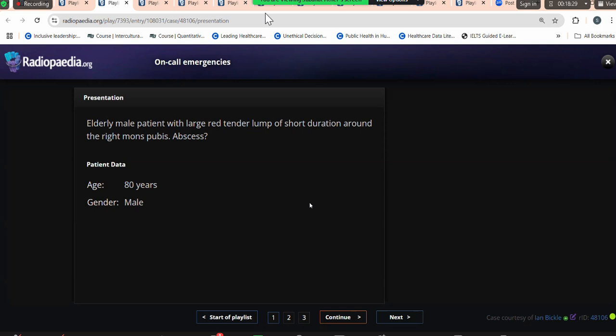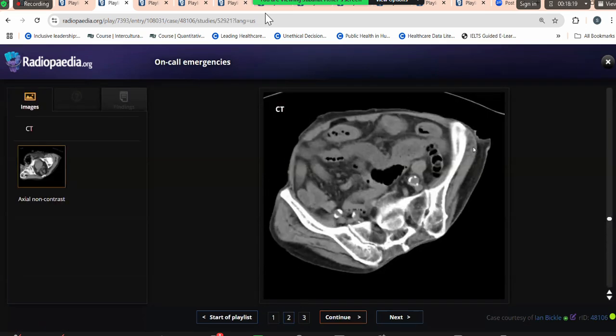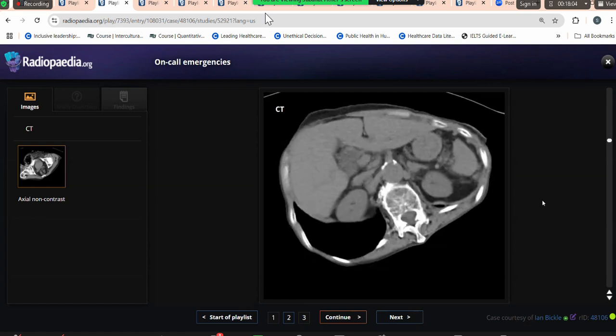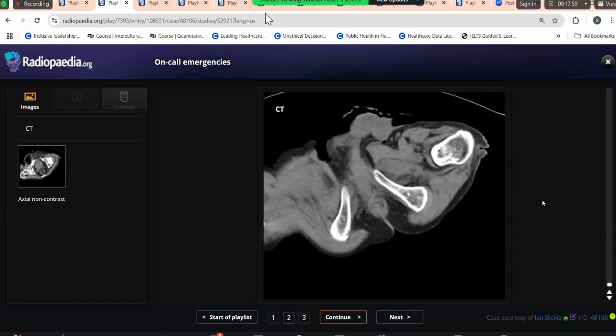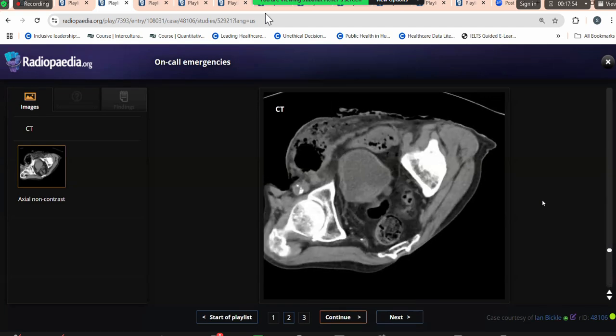And one thing which I want to feedback to all the candidates and all the participants here is that it is very important that you take a few seconds of your initial Viva telling, explaining what modality, what sequence, and whether plain or contrast enhanced, okay? So I would have liked all of you to start with that these are axial images of CT abdomen pelvis done without contrast. Yes, this is plain CT. Make it a habit. This will save you lots. So this would become very obvious that this is a plain CT abdomen.